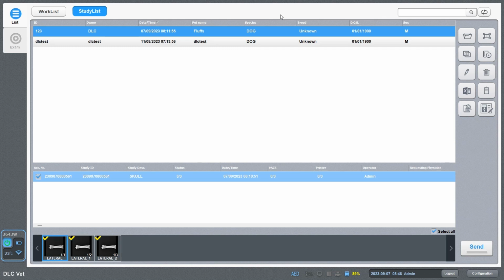Hey everyone, welcome to the third and final video of our Econsole training video. This is where we're going to look at the study list and all the post-processing options that we have available.